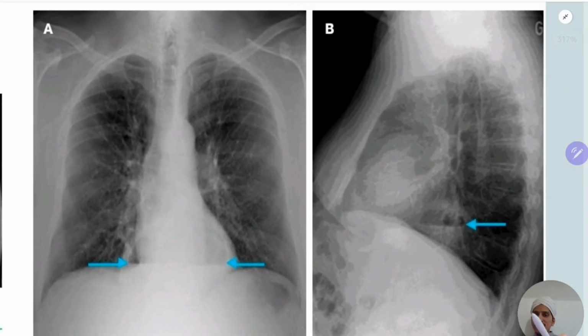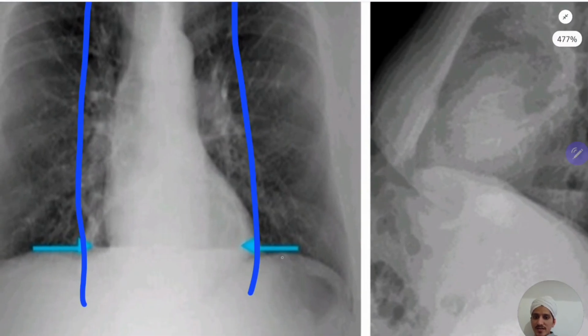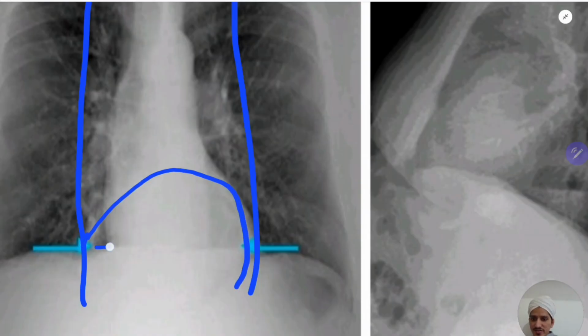Because we are discussing the mediastinal, we will focus on the middle part of the lung. There is no mediastinal widening here. Mediastinal widening is mostly present in the anterior and middle mediastinal masses. But you are able to see in the lower side this round-like opacity, and a straight-level opaque line you are able to draw here.